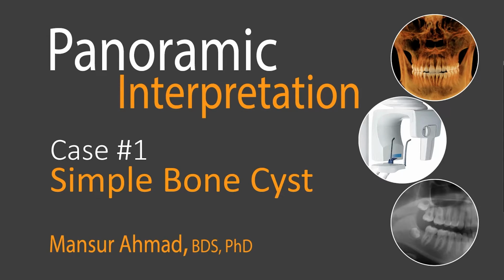Hello everyone. In the next few videos, we'll be reviewing several panoramic radiographs. As part of the Summer Interpretation Seminar course, you will have to participate in 5 panoramic radiographic interpretations. The first radiograph is about identifying the features of a simple bone cyst.